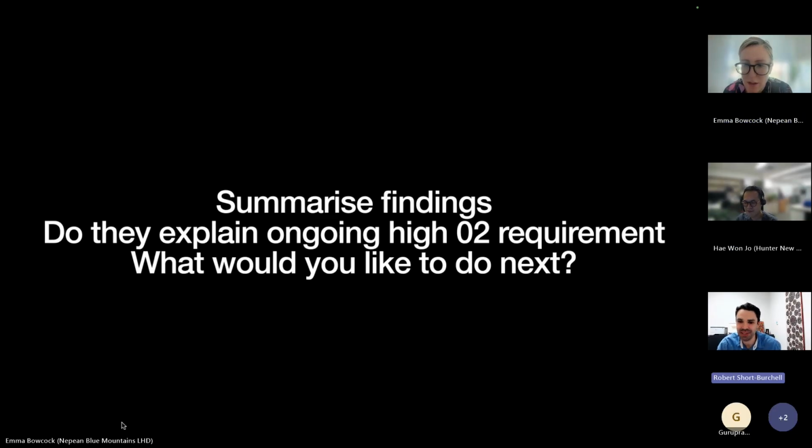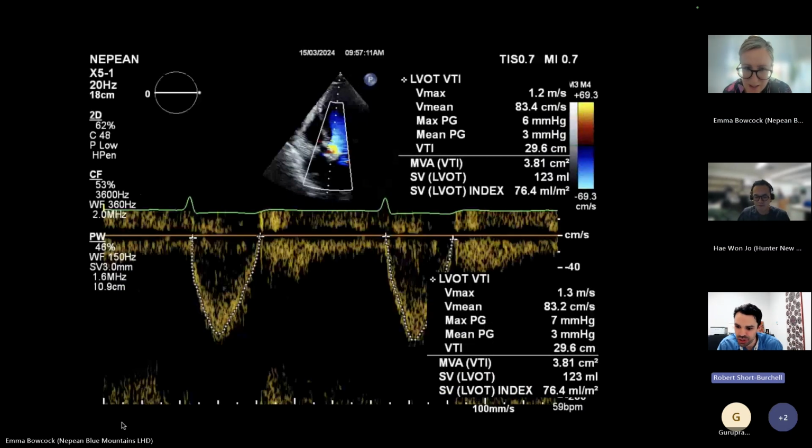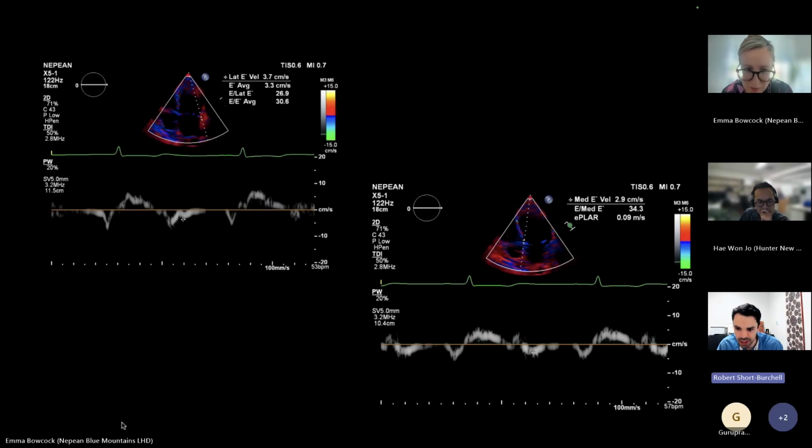Oh no, it's nothing to do with Juan's. I think Juan did great. I think it's the tissue Doppler imaging. The measurement of the E prime is inaccurate on the lateral. I wondered, because it seemed interesting that you started showing us all these other images like the LVOT, which also looked like it's inaccurately measured, whether that was why you were showing us these images, just to comment on how they've inaccurately measured these things.